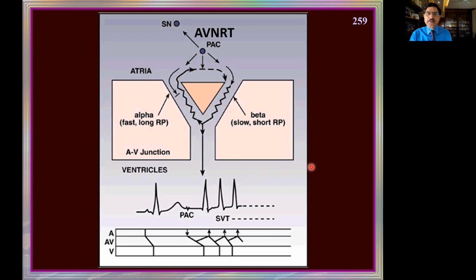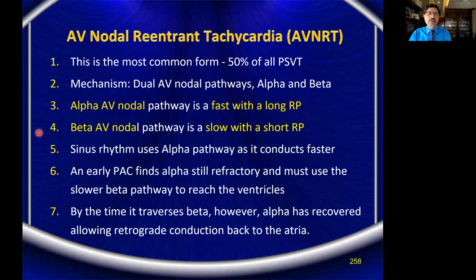Now let us read the English now. This is the most common form. 50% of all PSVTs are like this. Okay, 50% are like that.